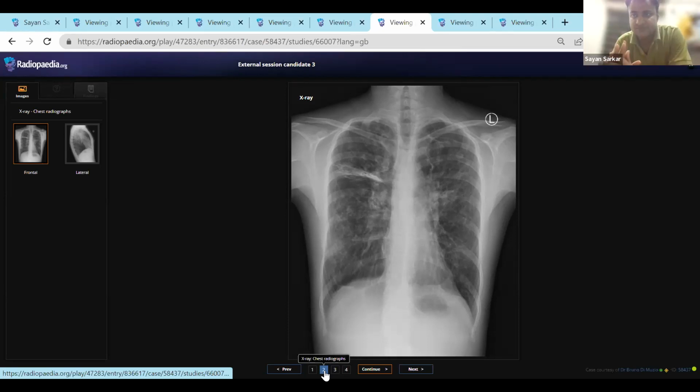Suppose you have a previous image and you have this image. It's a known case of cystic fibrosis. What are you trying to see? Yeah, generally speaking, nothing much. No, not like that. What I'm trying to say is that it's a cystic fibrosis patient, which is already known to you, right? So why are you investigating that patient this much? If he's a known patient, then this patient needs antibiotics for this acute exacerbation, acute infection. Yeah, so what are you trying to see in the images?